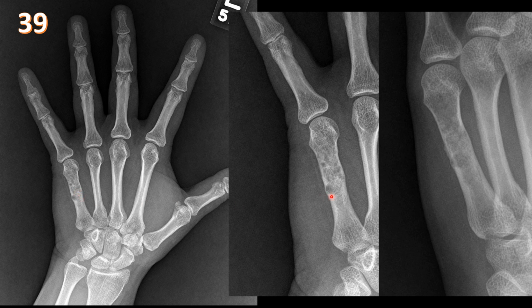So let's see. They can degenerate into chondrosarcoma, and the things that we're looking for is endosteal scalloping more than 2/3 of the cortex, cortical breakthrough, periosteal reaction and soft tissue component, or new onset of pain that is not associated to a fracture. All those things may suggest that there is degeneration to chondrosarcoma.